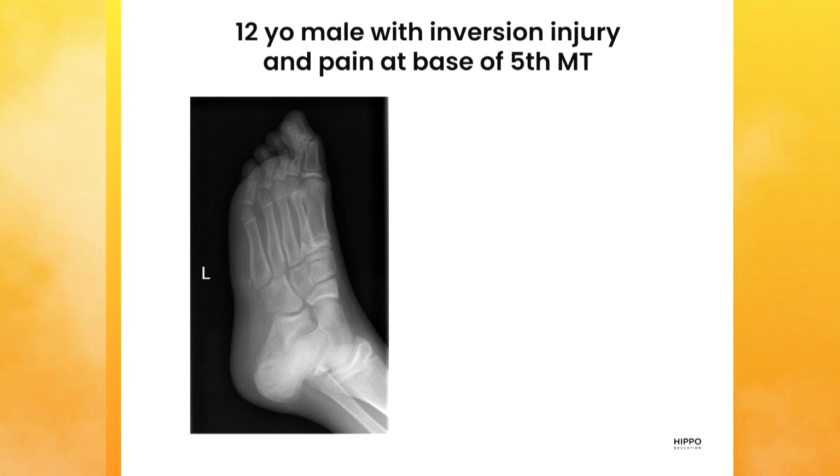Yeah, that's good. That's what I like. Keeps me employed. So what Saul's talking about is shown with this arrow here, and I agree. We see that, and we're trying to figure out if that's where he hurts, but is that something real or is that some normal variant?